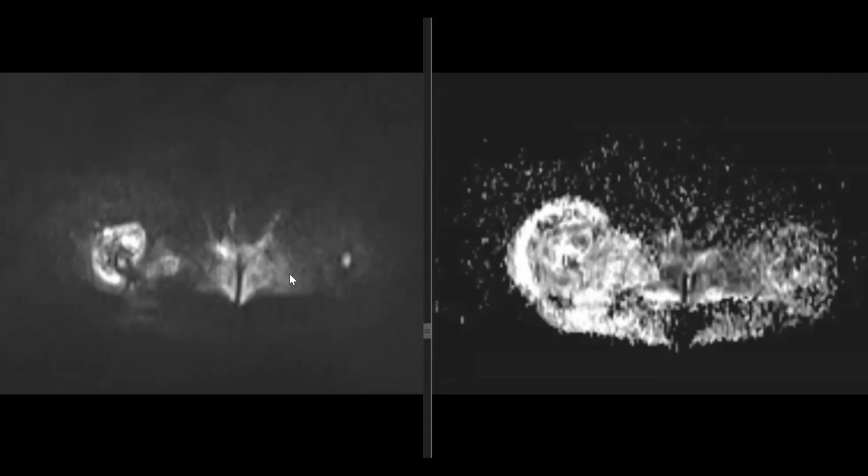Now conclude the case for me. The findings are likely suggestive of an infective etiology with a large abscess with adjacent marrow signal infective changes also involving the bone, osteomyelitis. I would immediately convey my findings to the referring physician, and this patient needs interventional radiology referral for the drainage of the abscess as well as orthopedic referral for the management and start of antibiotics. Okay, good.